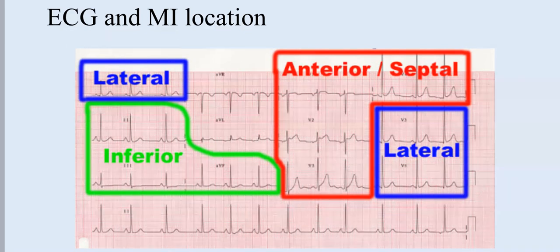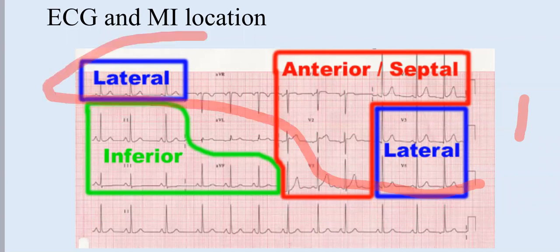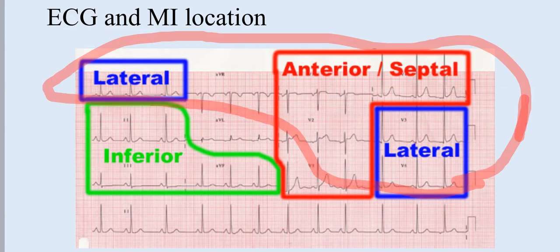Yani, if I have it all here, anterior, septal, and lateral, like this, I'm showing it to you here now. Okay. This is called extensive anterior. Extensive anterior, okay? Because the anterior, the septal, the lateral wall, extensive anterior.